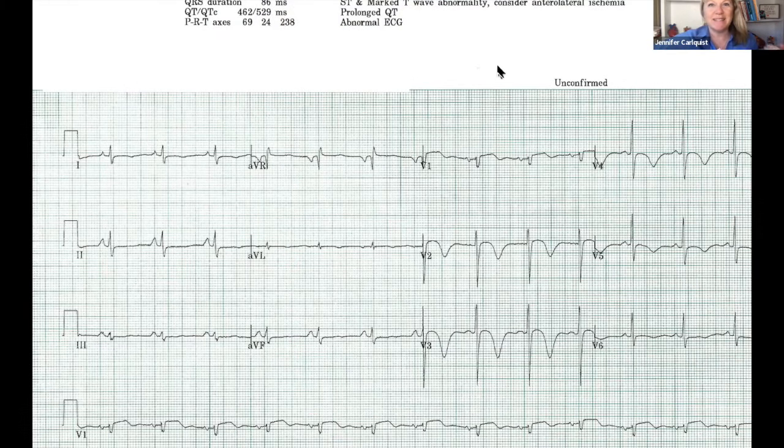All right, so let's practice with a real EKG. Now, this is someone who came in with chest pain, so we have to look at him through those lenses. And of course, we're going to scan the EKG for big sick, little sick, looking for, does it say STEMI at the top, looking for any serious arrhythmias that we would need to stop in our tracks for, and seeing that there are none. The next thing we want to do is look at the rate, okay?